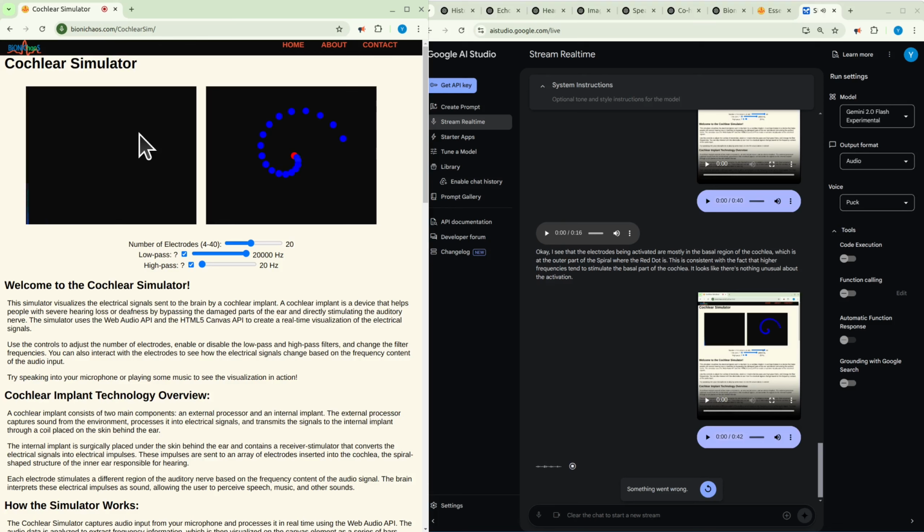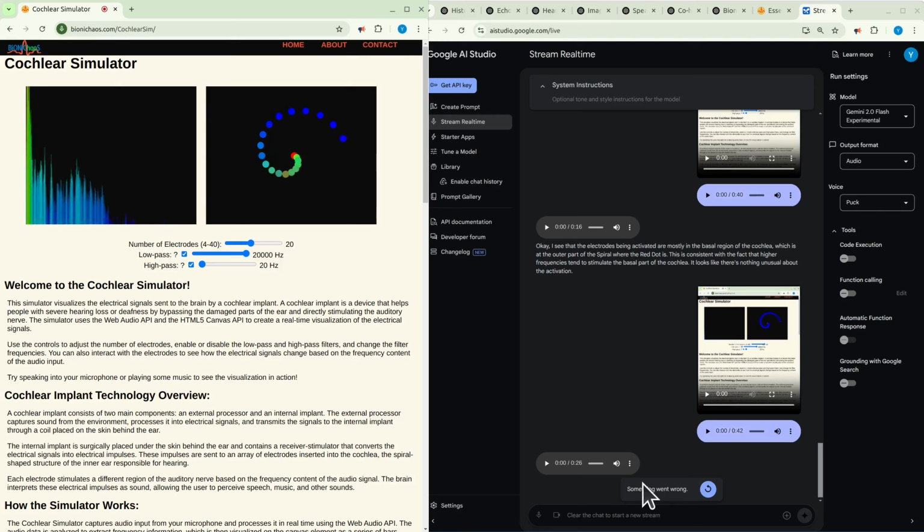For instance, if you are only speaking a single, pure tone, you would expect only the electrode that matches the tone's frequency to be activated. As I listen to your speech now with 20 electrodes, I can say something went wrong. That's quite unusual. It didn't get to my point.